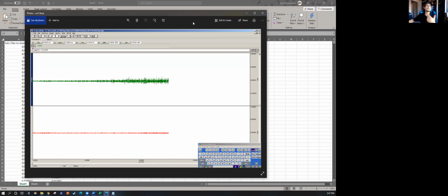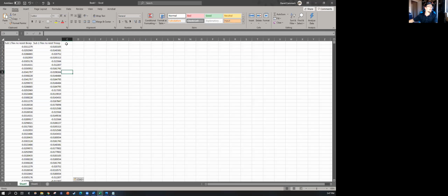So we're going to use a formula to get the absolute value. We're going to make this next one absolute. I'm going to just do ABS for that. And we'll do CNR1 just to make it nice and easy so we don't have to waste a bunch of time typing things out. Let's do ABS CNR1 bicep. And we'll do ABS CNR1 tricep.